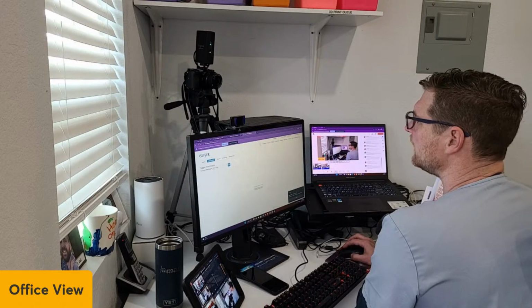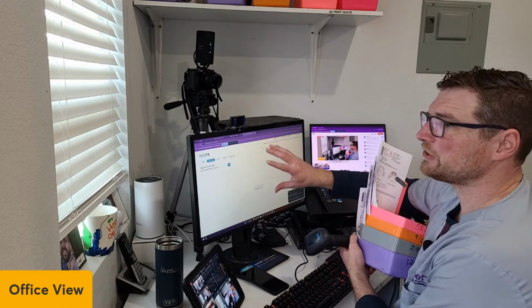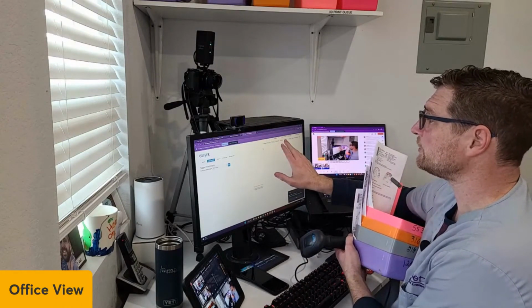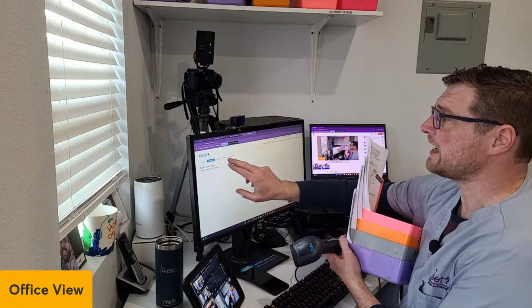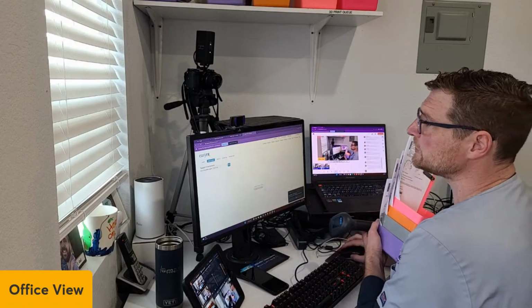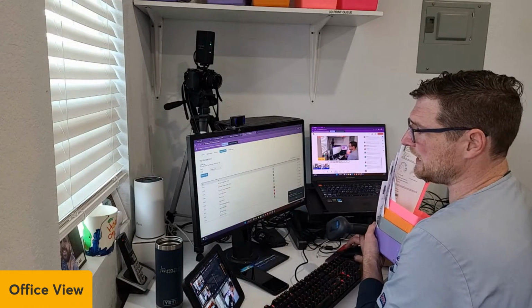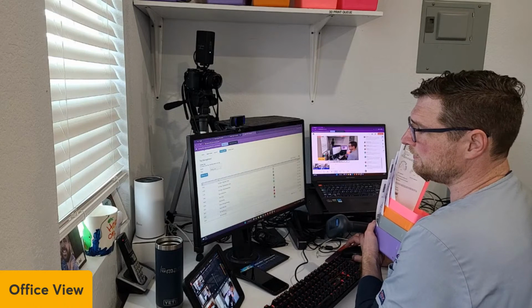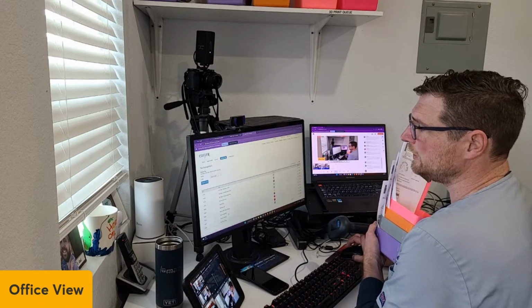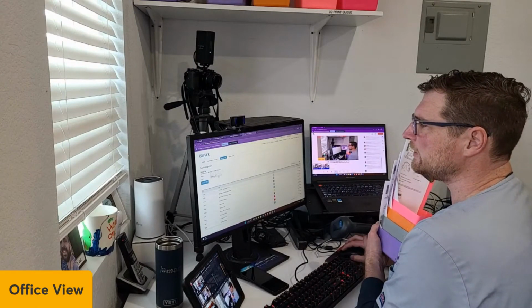Okay, you can just see this. So this is production. This shows the patient name when you do this. But this is the production under this tab right here. And you can tag RXs and manage them. So you create your own tags. I have different tags: T3 set, sent to ABR, 3D Tech Print, 3D Tech Q. Whatever you use internally, you can create it here, and then you can choose whatever color you want.